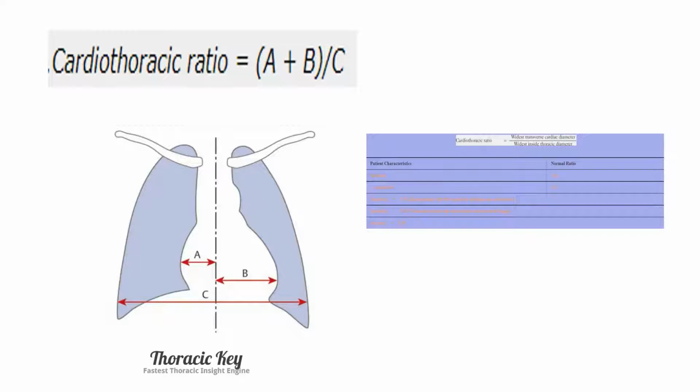And the other thing which I also get amazed by is that sometimes, though I didn't find it in books or literature, because what we are seeing here is what? These borders. These are borders, right? The outer borders of the heart.